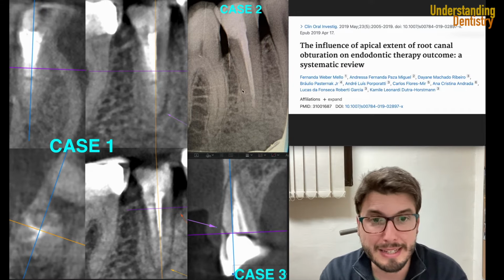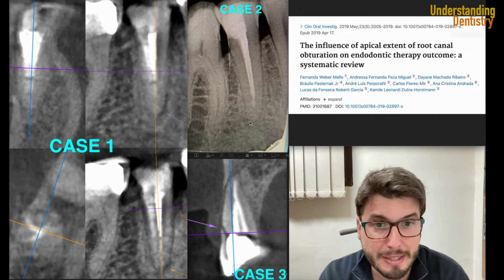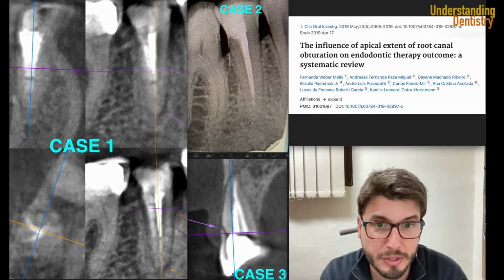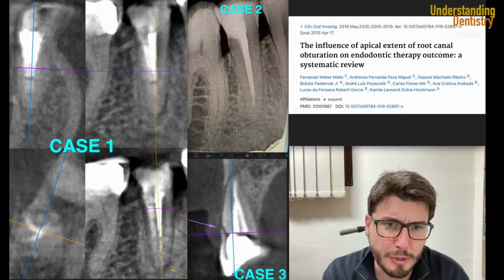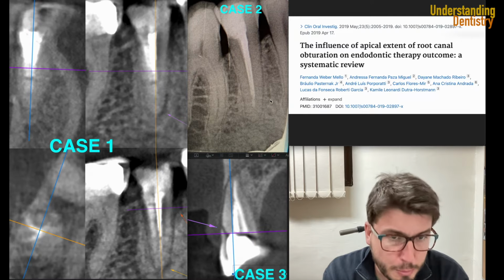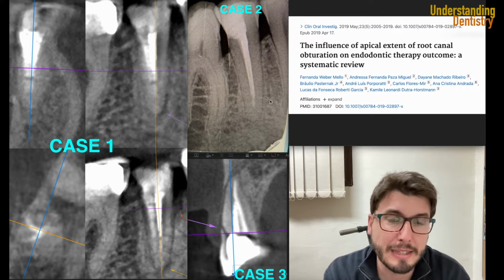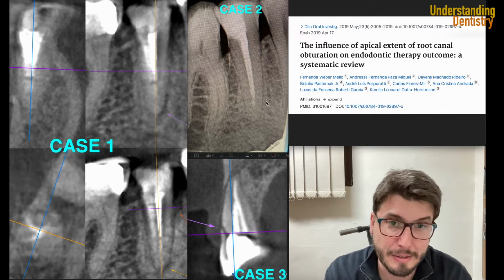We need to understand that the periodontal ligament space is not widened, or at least it's in a normal situation here. If we had a more condensed radiopaque area than this, it could be condensing osteitis, for example, and then you would at least follow up the case.